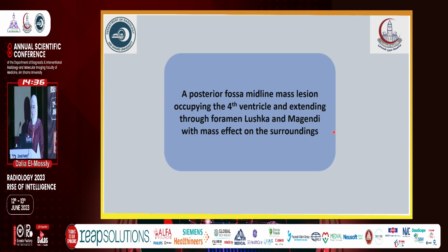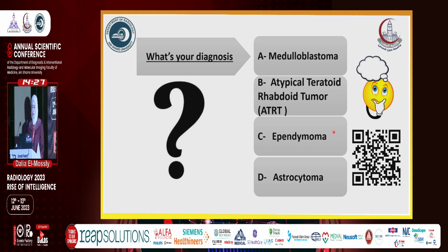So we are dealing with a posterior fossa midline mass lesion occupying the fourth ventricle and extending through foramen of Luschka and Magendie with mass effect on the surroundings. Our differential diagnosis includes medulloblastoma, ATRT, ependymoma, and astrocytoma.